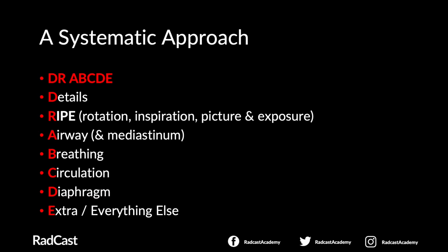So what does it stand for? D stands for details. R stands for RIPE, which stands for rotation, inspiration, picture, and exposure. The A stands for airway and the mediastinum. B stands for breathing. C, circulation. The D stands for diaphragm, and E stands for extra or everything else.